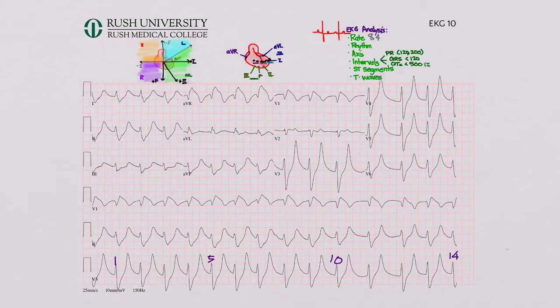I don't know, maybe it's coming from somewhere else. So we're not going to say sinus. Let's come back to that.